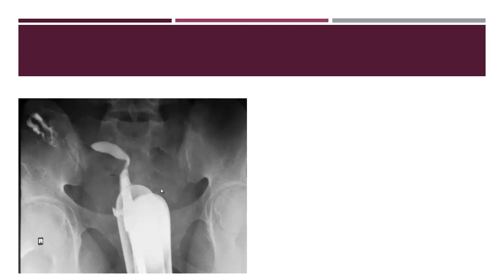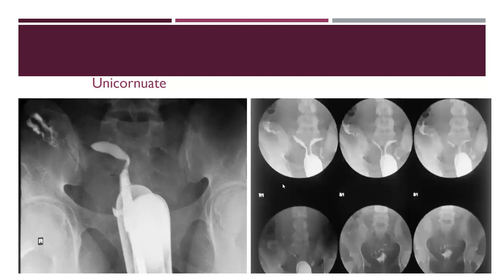Again, this is abnormal uterine contour. It has a banana-like shaped appearance of the uterus, but in this case, take care that the uterus is not pulled by the tenaculum or by the vulsellum. Second, take care that it is not one orifice of a second orifice of uterus didelphys. So this is unicornuate uterus, but you must take care that there is no other one.